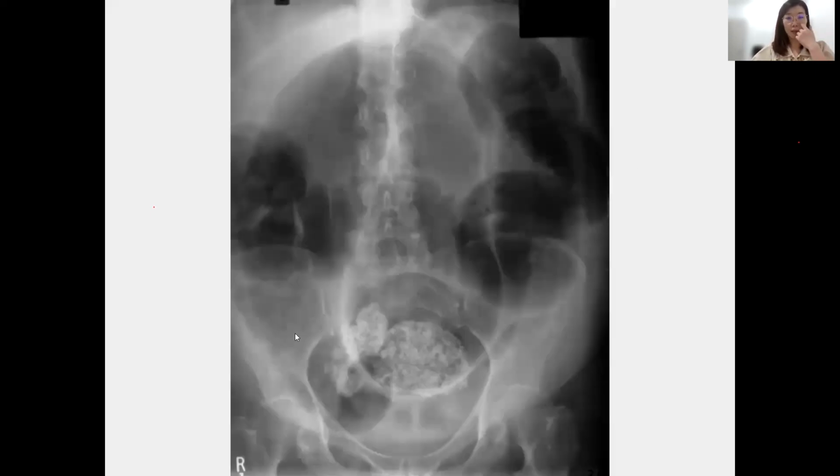So what about this specific diagnosis? It's also large bowel obstruction, right? Yes, it's also large bowel, but what is the diagnosis for this X-ray? Toxic megacolon. Okay, maybe, but not. This is specific. Once you see this appearance, there is only one diagnosis, no differential.